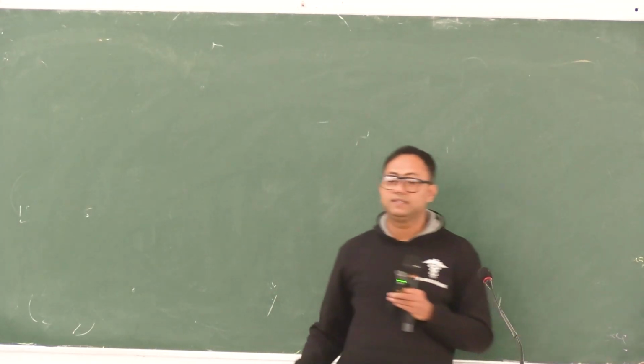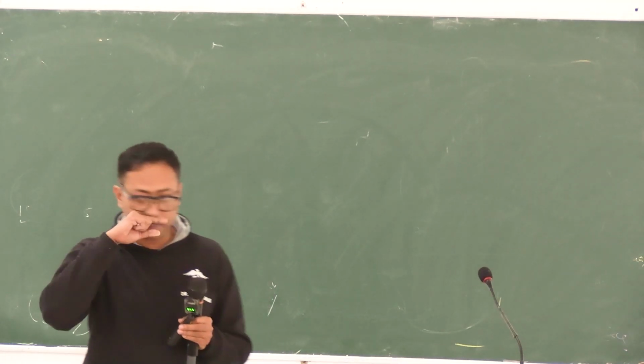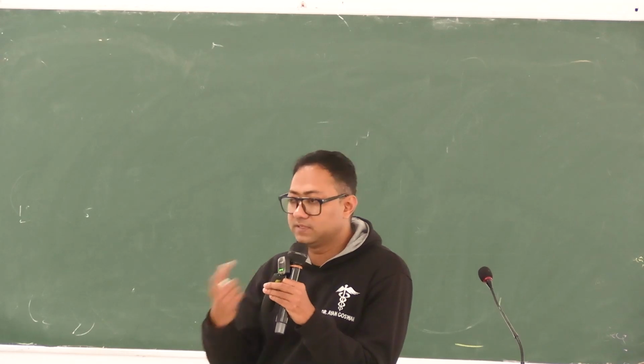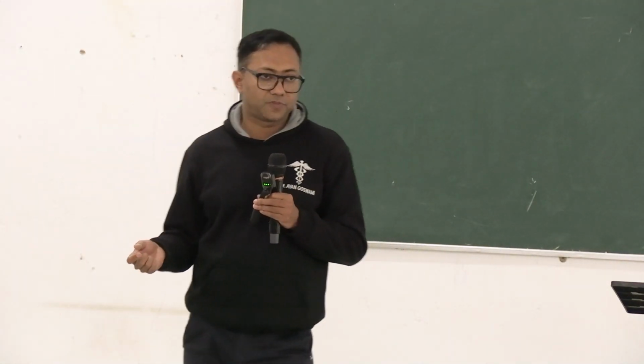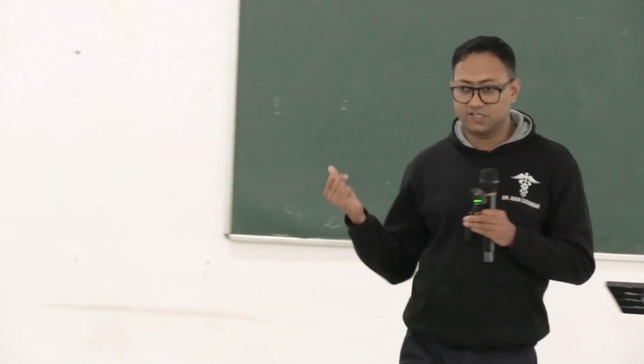The ECG axis is a very important thing that we need to check while looking at the ECG strip of a patient. It gives you the result as either normal axis, left axis deviation, or right axis deviation.